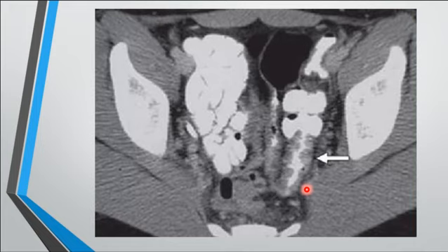Herpes simplex. But in order to pass the exam, you have to ask a question. Previous history. Where would he get herpes? In the sigmoid. Sexually transmitted disease. Is he homosexual or not? This is called gay bowel syndrome. This is a homosexual teenager with herpes simplex affecting the sigmoid colon. And it is type 2. Type 1 is the oral one.